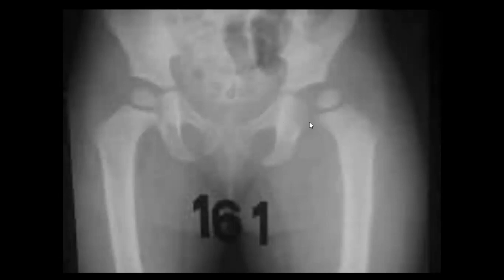Maybe it's a bit far from what it should be here, right? But what is more, the joint space here looked like a dislocation, but more than dislocation again, and this is a child, and when you find this, you are in something like an emergency.